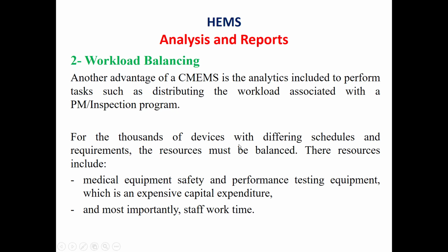For thousands of devices with differing schedules and requirements, the resources must be balanced between the staff, the available testing equipment, and the PM schedules.